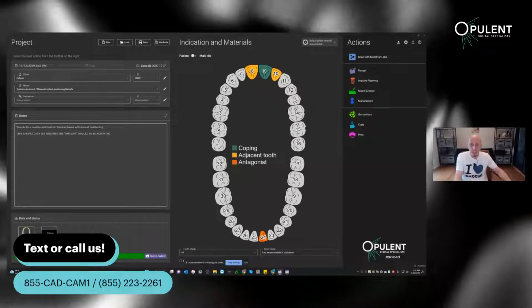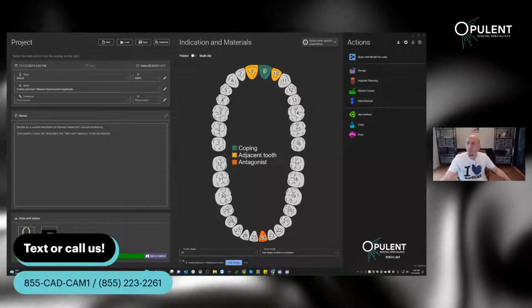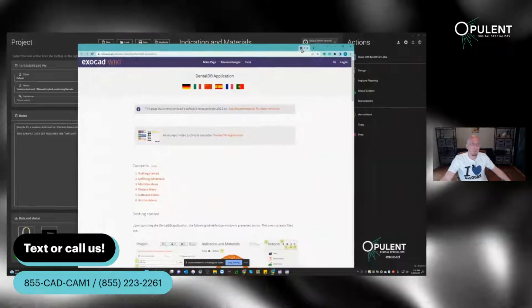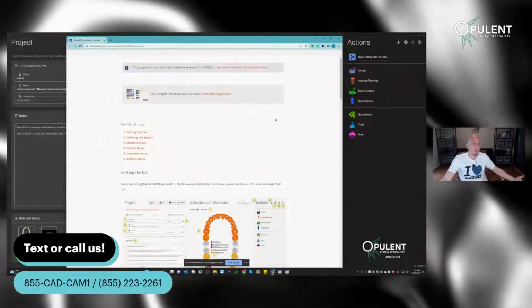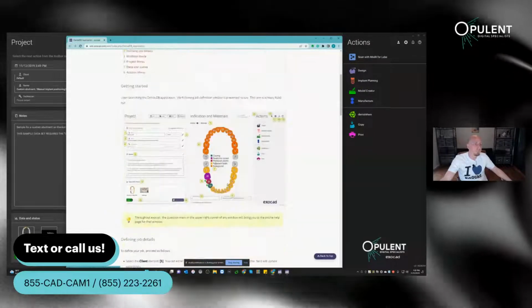If you don't know the wiki yet, go to the wiki, use it. So click on the question mark somewhere, and then it gets you to your wiki. It tells you how to fill out everything.